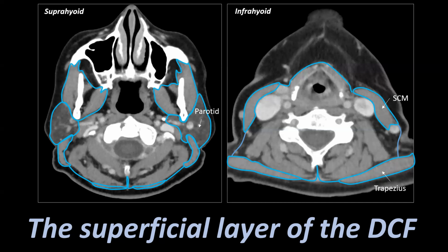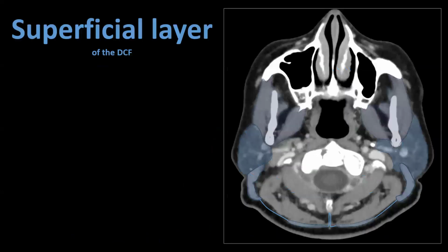Let's move on from the superficial layer to the middle layer of the deep cervical fascia after we've gone through this slide.